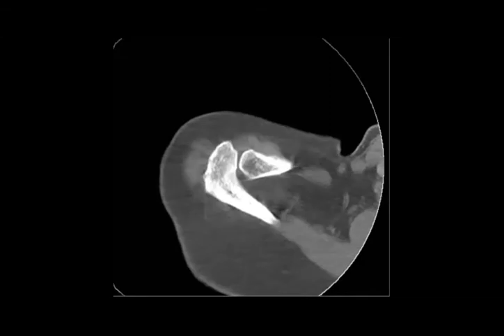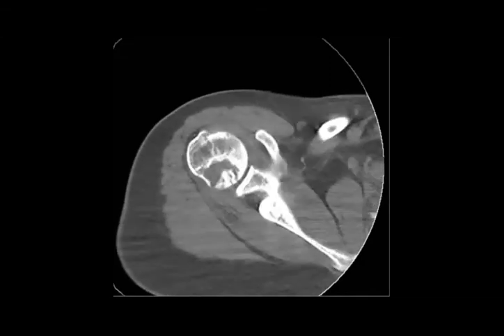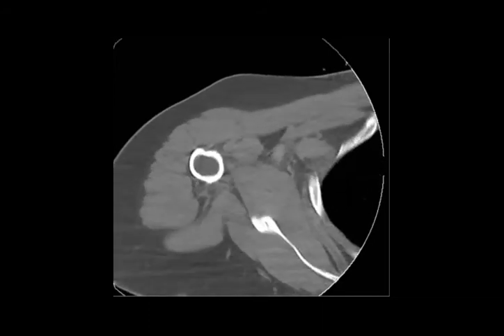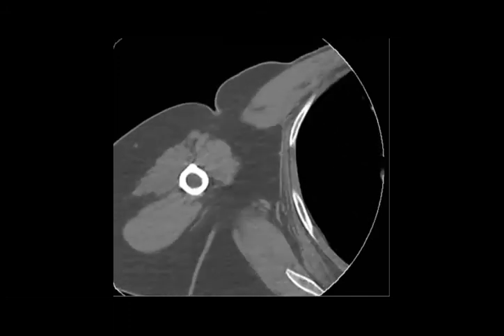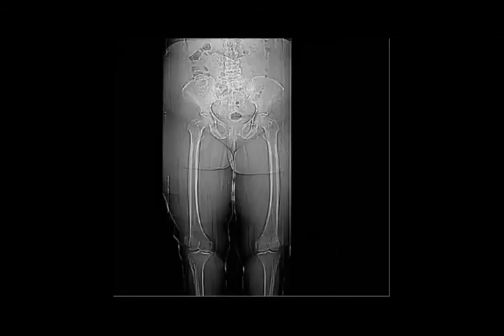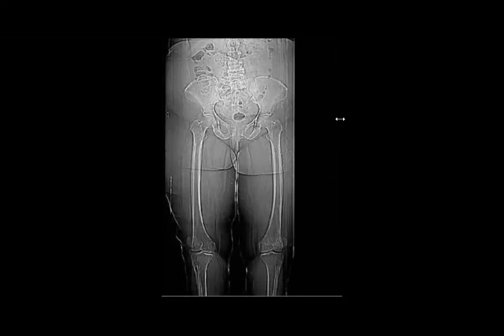I will show you more. It can be metastasis, yes. If this patient has lymphoma, it can be as well, but you will search for other findings. Zuhair, take care about the age. When you mention a differential, it should be linked to the age. So this patient, again, you can see that he again did a scout.